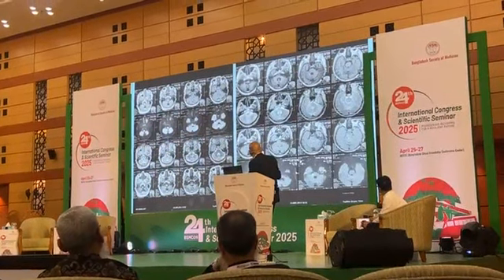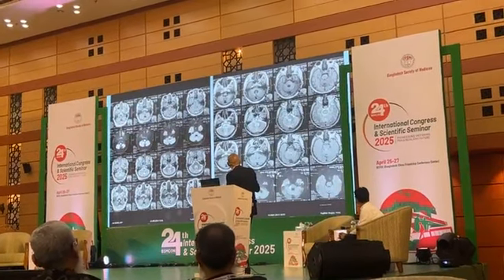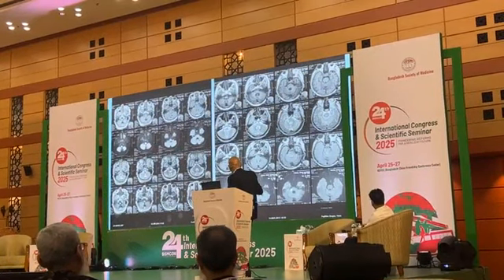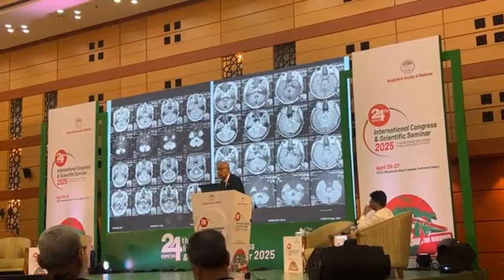This is again a lesion in the right side of the pons. Small lesion in the right side of the pons. You can see much better here in DWI. This is a right pontine infarct. Will give rise to right pontine syndrome.